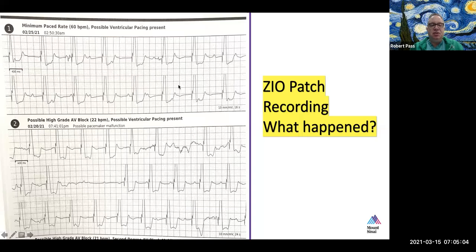So this is just plain ventricular pacing, so-called VVI pacing, right? First letter stands for the chamber that's paced. The second letter stands for the chamber that is sensed. And then the third letter is suggesting that it will be inhibited by ventricular activity. And the other reason you know that it's not dual chamber is that the R-to-R interval is very fixed, right? In all the panels, the R-R interval is very fixed.